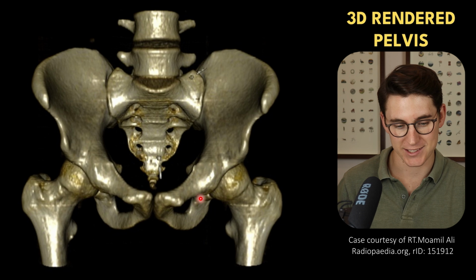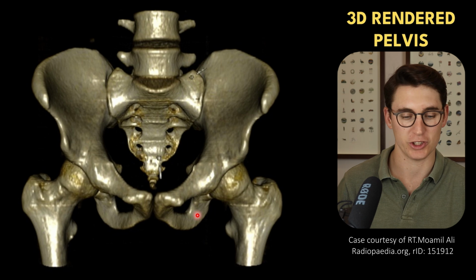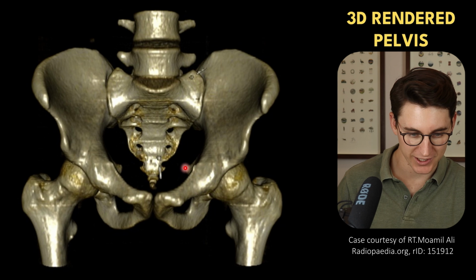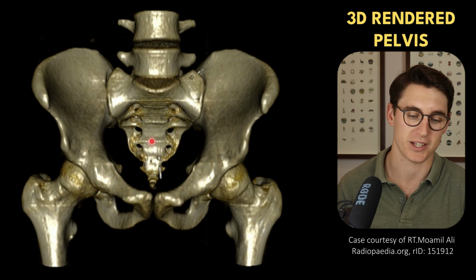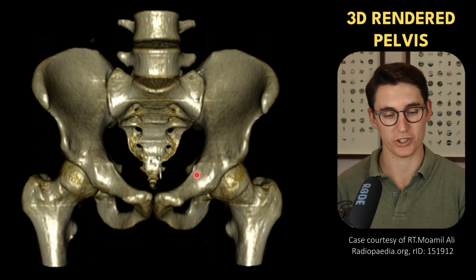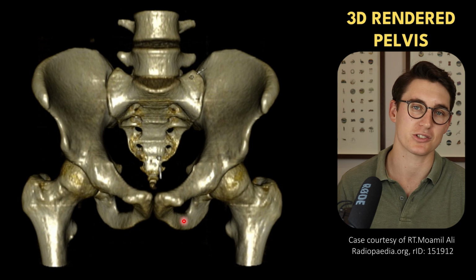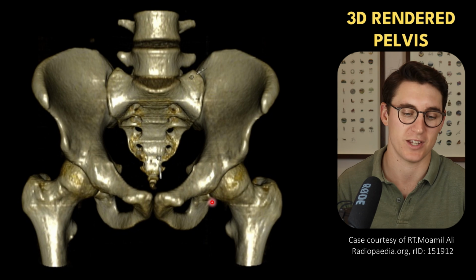Our ischium then heads up towards our ilium posteriorly, making up our ischial bone. Posteriorly here you can see our ischial spine also extending towards our sacrum on that side. Our acetabulum is the hollowed out portion created by all three parts of the pelvis, and that creates the socket for our ball and socket joint of the hip.